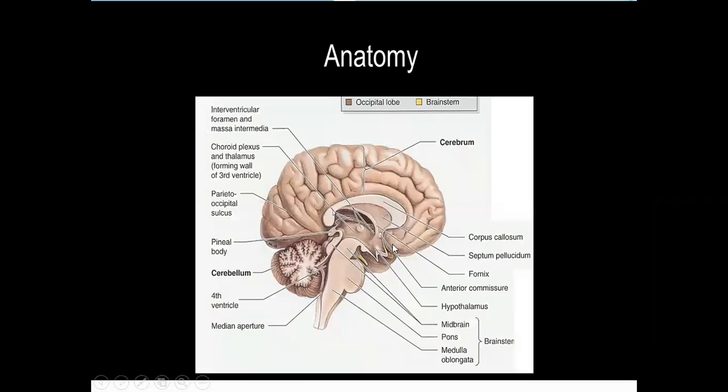Progressing. This is a very important landmark also. You look at the corpus callosum, the septum pellucidum. We all see these structures. The cerebellum, the fourth ventricle, you expect to see these. The pons and the medulla, you expect to see them. And again, we are coming back to these regions, very important in brain maturity. We'll be able to talk about that in the later slides.